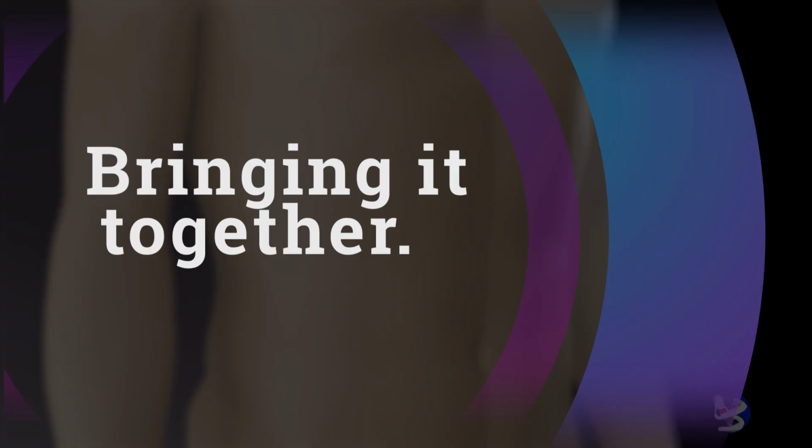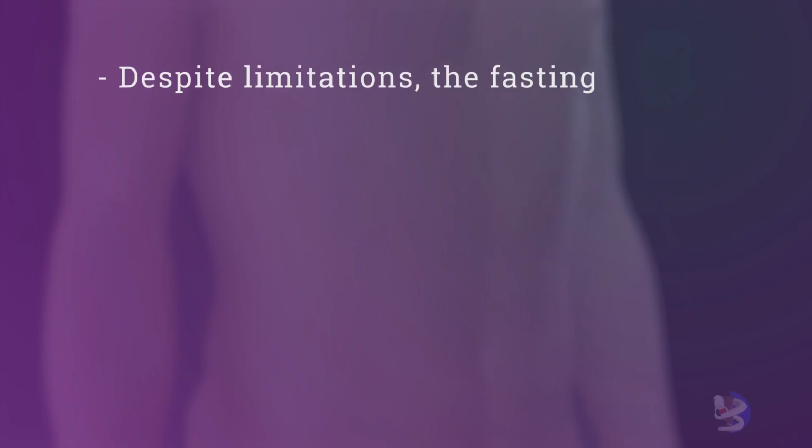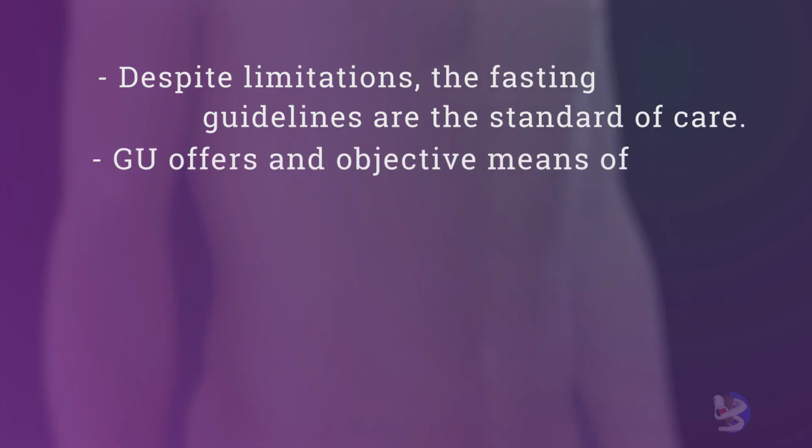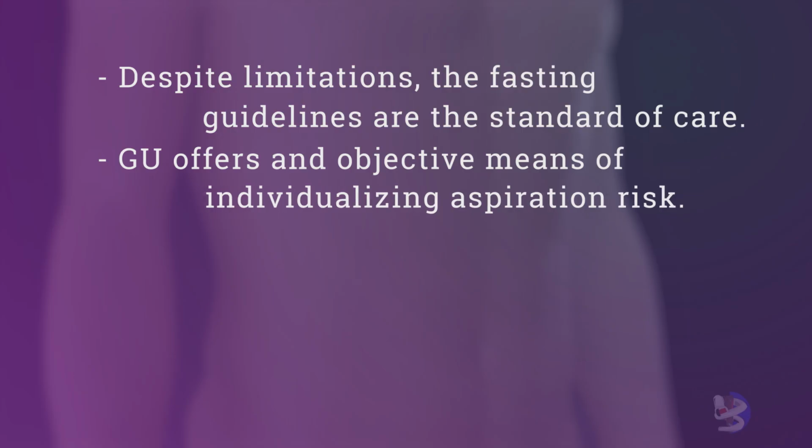Bringing it together. Despite the limitations of the perioperative fasting guidelines, they remain the gold standard, but will likely change in the future in light of the use of point-of-care ultrasound. It is clear that it offers an objective means of assessing and individualizing aspiration risk and to guide management. This is especially important in situations in which the risk is unclear or undetermined.